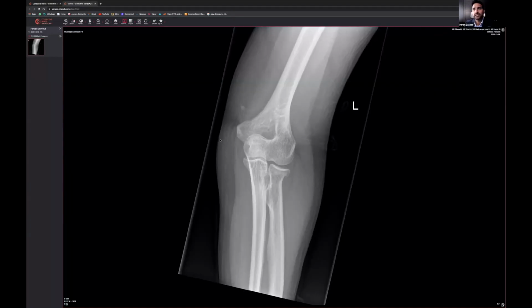So this one is an adult patient, and this is in context of what we were talking about earlier with the pediatric patient. Pediatric patients, generally speaking, you get supracondylar fractures, but with adult patients, I would highly recommend you go for that radial head. High yield area, radial head is most likely where people get fractures.